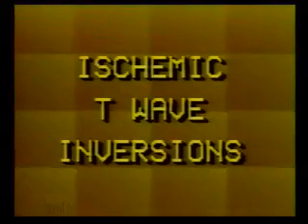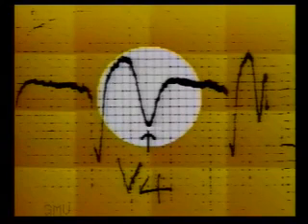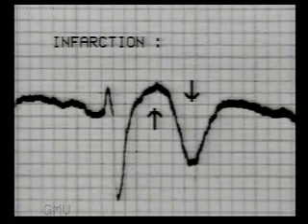Now we come to the ischemic T wave inversions. The T wave of myocardial ischemia is very typical. Normal T wave has asymmetrical limbs and flat top, but in ischemia it becomes symmetrical and pointed like an arrowhead. First we will consider a patient who is in acute chest pain. Mild ST elevation with deeply inverted and symmetrical pointed T waves is typical of fully evolved myocardial infarction.